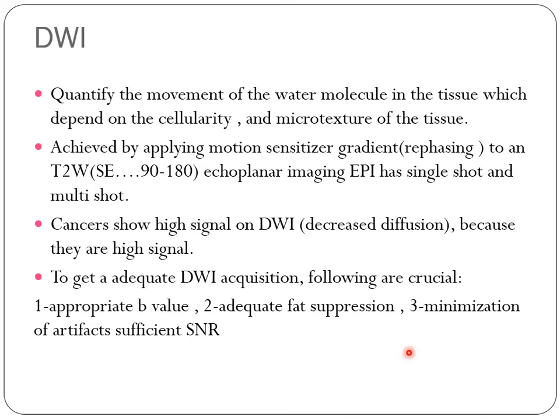The basic idea is that you use diffusion weighted images to detect water molecule motions. Are the water molecules moving freely like in normal tissue, or is diffusion restricted? Is it crowded and held up in a tiny space? Inflammatory lesions and breast cancers, of course, are just like brain diffusion, the same idea. Whenever there is edema, there is restricted diffusion. The water molecules cannot move, and that's why it is shown in diffusion weighted images.